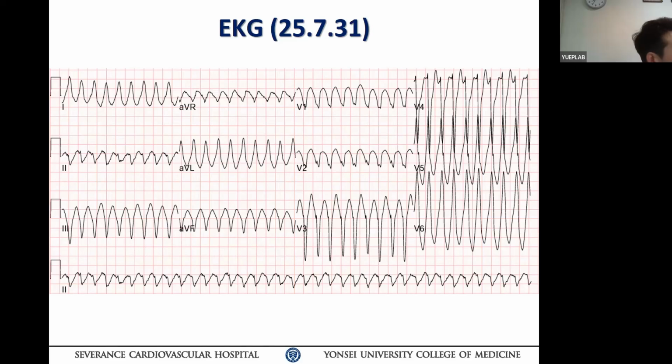I think when you see lead 2, the fifth beat is quite different from the others, so maybe that can be the fusion beat. So I think it's VT.